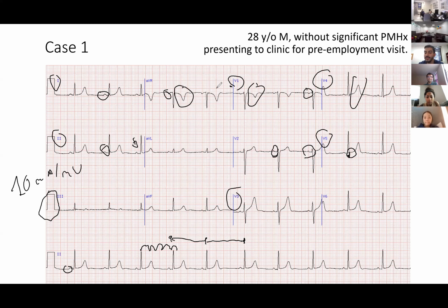And then the QT. A very good way to assess it when the patient has a heart rate between 60 to 100 beats per minute, meaning normal heart rate, is to just check your RR interval and check how much your QT is percentage-wise. If it is less than 50%, or one half, of your RR interval, then most likely your QT, independent of correction, is going to be normal. That's a quick way to do it. If somebody is asking you to actually calculate it, there are formulas, like the Bazett formula and the Fridericia formula. We'll cover it some other day probably.